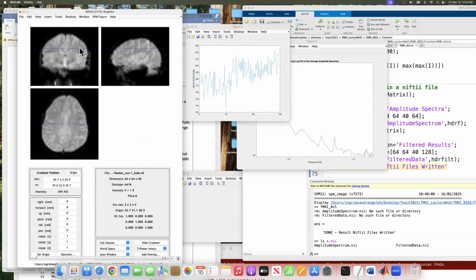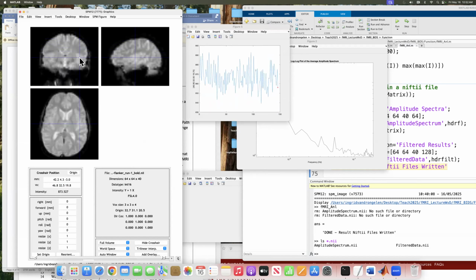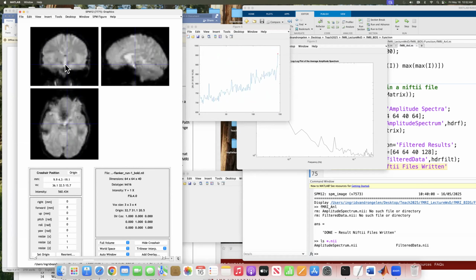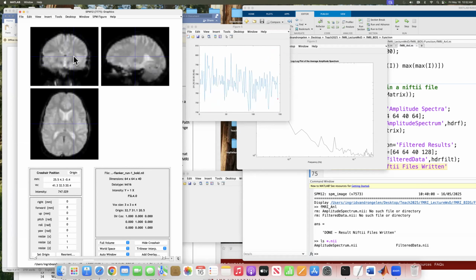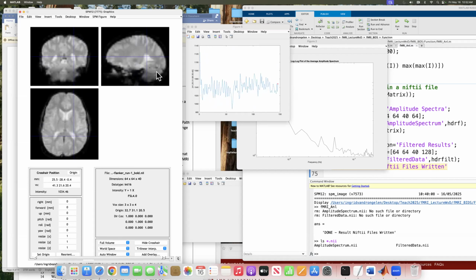And if you do that, you can see that while you're going to a different voxel, this area that shows the data is also going to show you different data. So you can basically do a lot of stuff. If you were interested, hey, what's going on here, you could put your cursor there, and you get your data, which is really nice, of course.